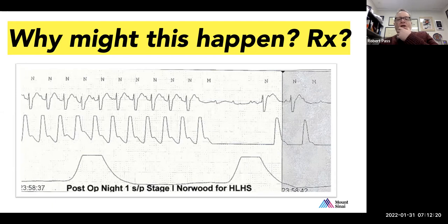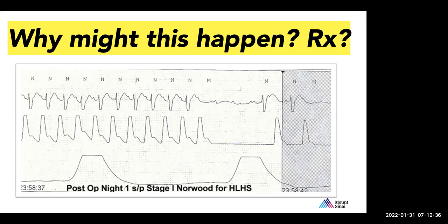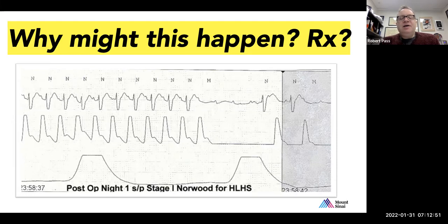So Grace, what would we do if you observed this at 11:58 p.m., as this tracing suggests? I would put up a backup VVI pacer if this is not happening frequently. And then I would observe the patient for now. I'm sorry, did you say it's post-op night one? Yes, night one. Now, why are you putting a backup VVI?